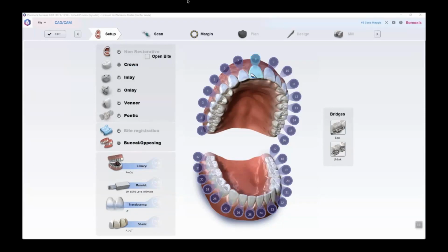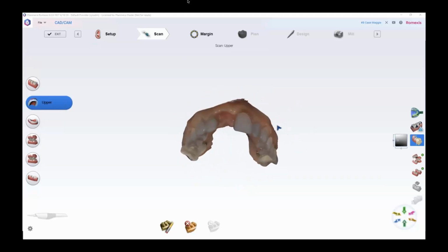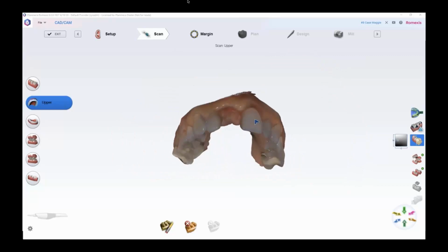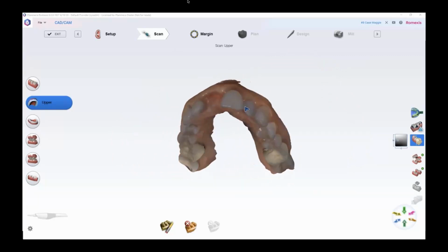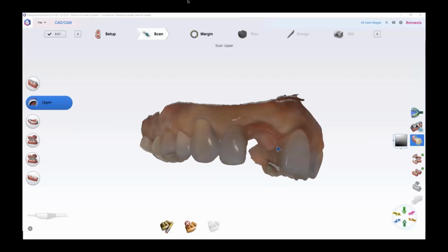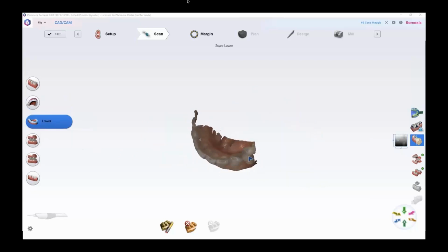And what I normally do is select the tooth site of interest, and I design it as if we were going to do a CAD/CAM crown. Once we do that, I'm going to get intraoral scans of the arch of interest. So in this case, we're looking at implant site number 8 or 1-1. And we also need the intraoral scan of at least the opposing segment, enough data that we can see the occlusion.